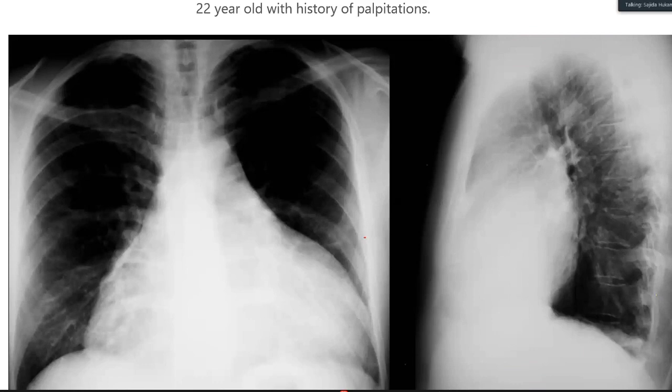On lateral chest radiograph, I can appreciate a radio opacity in the middle zone, and the left pulmonary artery appears to be bulky.